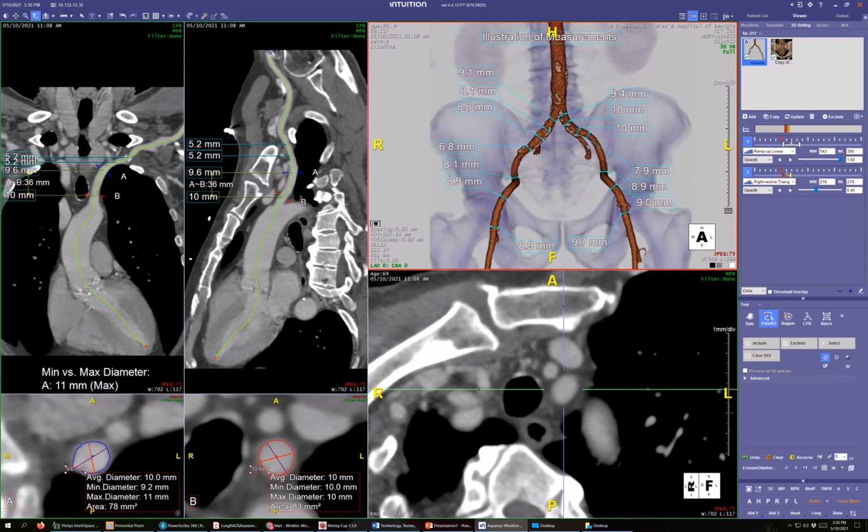Quite curious. The iterative reconstruction, from what I understood, seems largely limited by computational power. Well, we've already moved past it to AI-based reconstruction. What is going on here? Well, that's that. Better pause this.